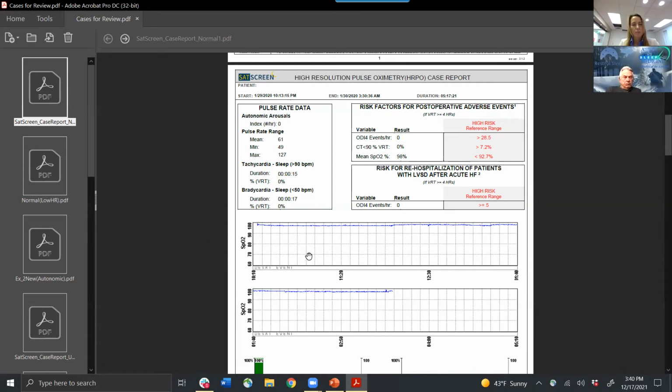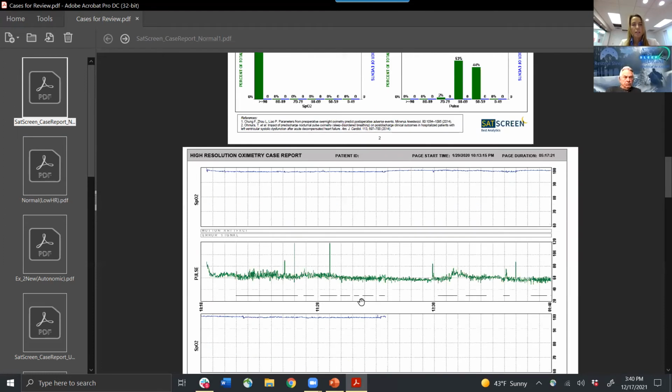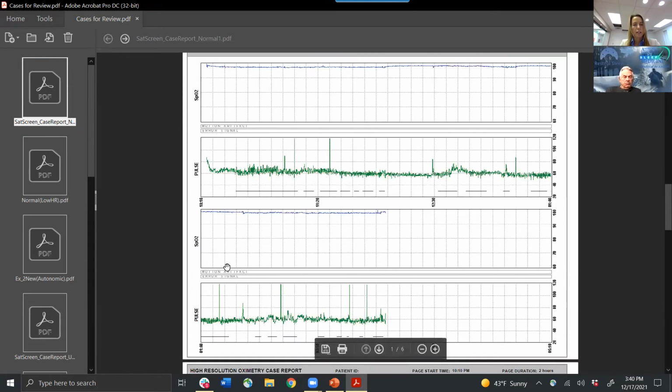The next thing that we have here on the report is the overall SpO2 for the night. So the less ink we see on the page, typically the better. For most patients, if it's relatively flat and stable, that indicates obstructive sleep apnea is unlikely. And on the subsequent pages, we also see not only SpO2, but also pulse. And if you have a Minolta, we'll look at artifact data and error signal as well. Error signal is in the sleep sat as well, so you'll see that highlighted here.